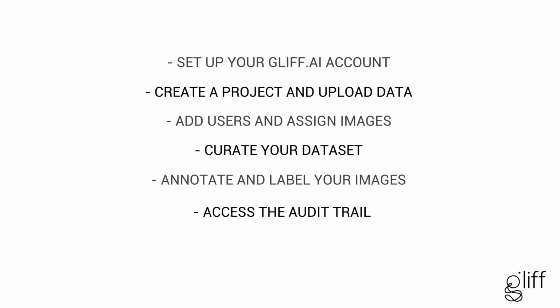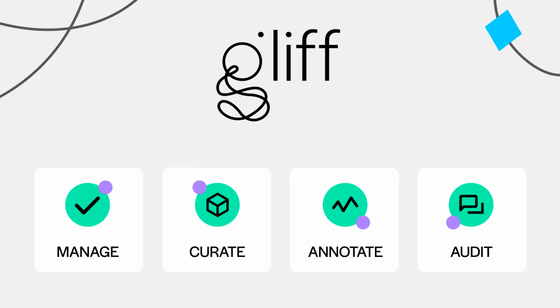and upload data, add users and assign images, curate your dataset, annotate and label your images, and access the audit trail for your dataset development. The four main tools which will be shown in this video are called Manage, Curate, Annotate, and Audit.